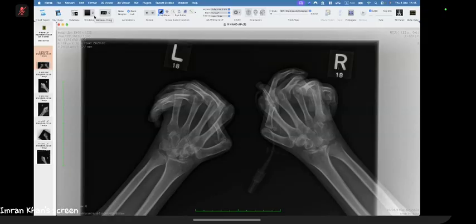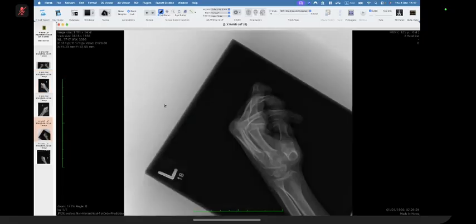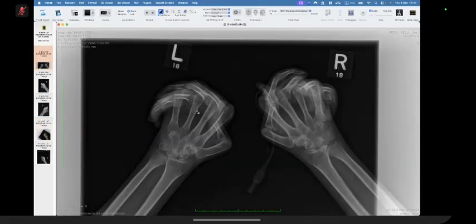Next step will be to review the other joints and previous radiographs for other appendicular joints. Also will ask for rheumatoid factor and CRP investigations and rheumatology MDT. Okay. All right. Stay with me on this case.